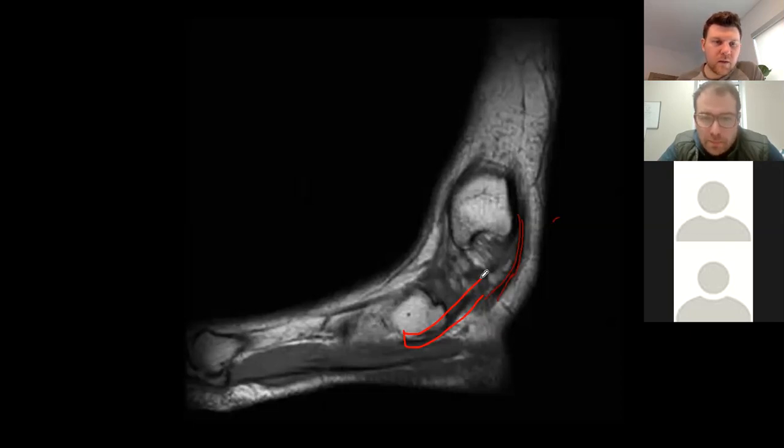So we're looking at the navicular at that point, and then distal being your cuneiform and first metatarsal. And again, I said this earlier in the chat, it's very important to look at the whole picture to find out where you are, because you can use, I call them context clues, although that's not appropriate for this, clues around you to figure out where the heck you are.